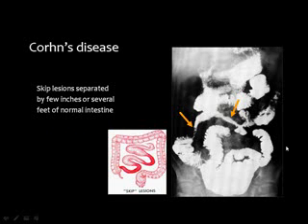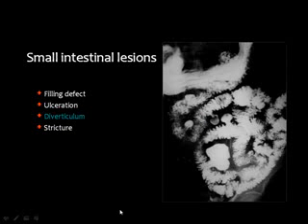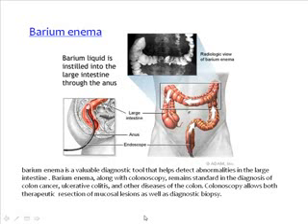Then Crohn's disease also may produce multiple strictures in the bowel, and this is an example. Stricture here, normal segment, and the stricture there. This appearance is known as the skip lesions, which are also characteristic of Crohn's disease. Diverticuli in the small bowel are commonly seen in the duodenum, but may be seen in the small bowel, as you can see here, multiple diverticular outpouching in the jejunum.